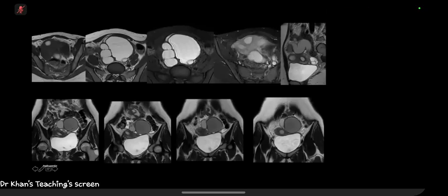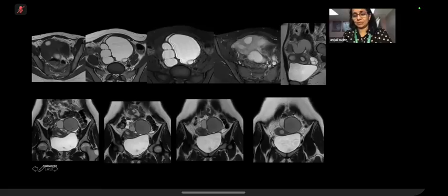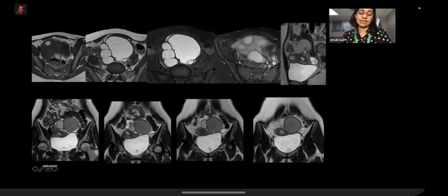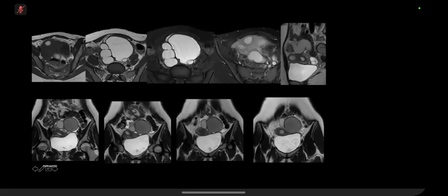Okay, so look at this T2 sagittal. Looking at the tubular structure, what comes to your mind? The fallopian tubes. I was thinking whether this is hematosalpinx on both sides. Good. Hematosalpinx is there, and you have an endometrioma. Endometrioma, with the shading sign.